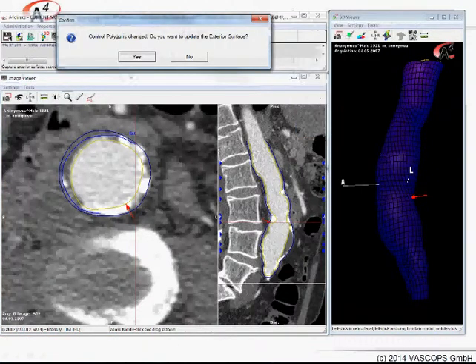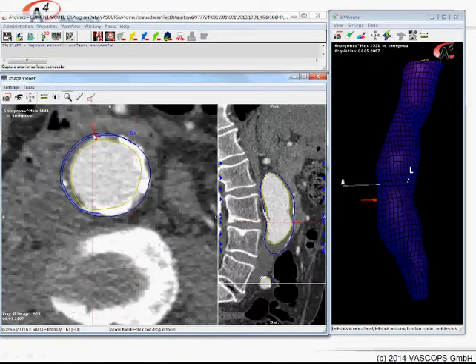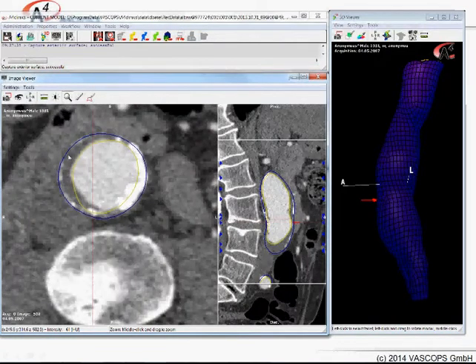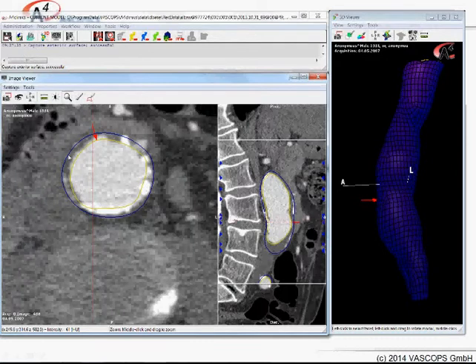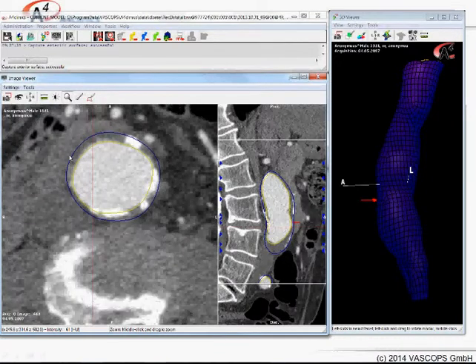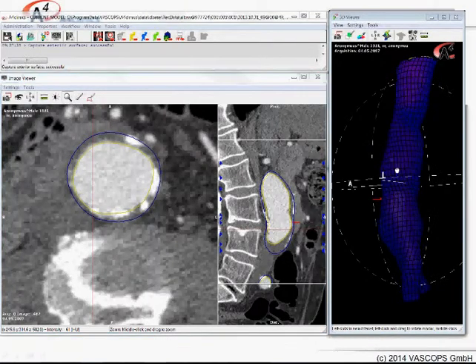Then I just close that and say yes, please update my balloon model, and then you're going to see that the model tries to incorporate your definition here. But of course, since the algorithm is fully 3D, you might not always reach exactly where you want to go, simply because your information is contradictory with the information which is already here. So this is basically how that works.